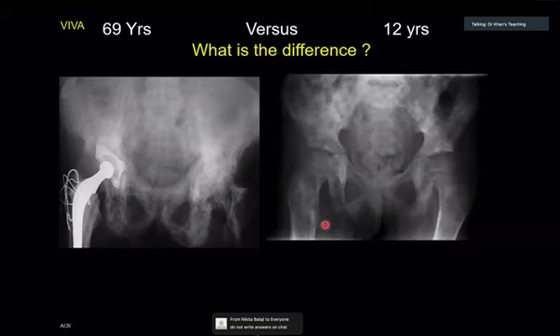First of all, I just wanted to show it to you because this type of film of diffuse Paget's disease has been confused by candidates, particularly overseas candidates, for the simple reason they have not seen that this can happen. And the key finding is coarsening of trabeculae, age, and then enlargement of bone.